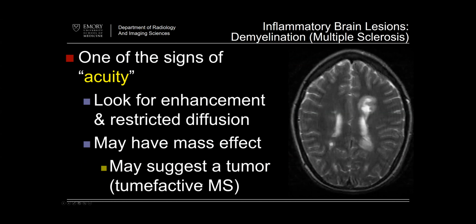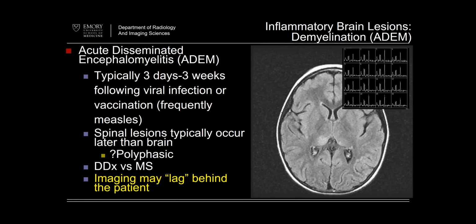Certainly these things can be big and have a tumefactive appearance to it. If you think something could be a tumefactive MS lesion, it's a good time to put the brakes on, talk to your friendly neighborhood neurosurgeon, and ask them to consider the possibility that it's MS. So typically we'll work up from there. Sometimes you're going to see a lesion, like you could look at this and think, I wonder if that's a thalamic glioma, got some positive mass effect. It's not isovolumetric.